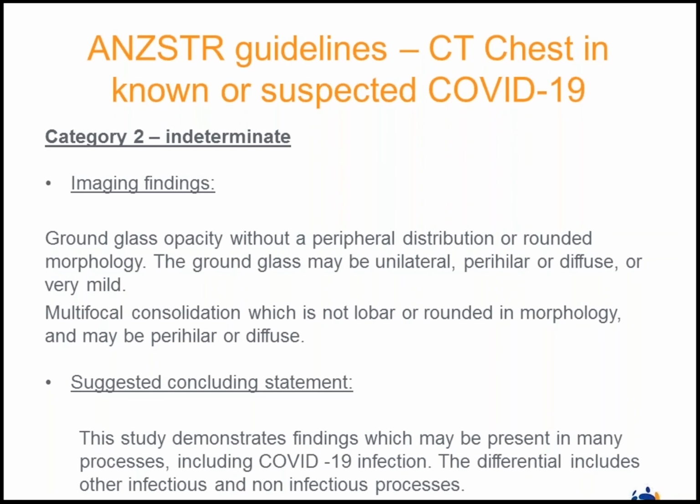But the concluding statement we've suggested is: findings that may be present in many processes, including COVID-19. And so this could be infectious as well as non-infectious processes. And if you're worried, really you should be doing a PCR test.